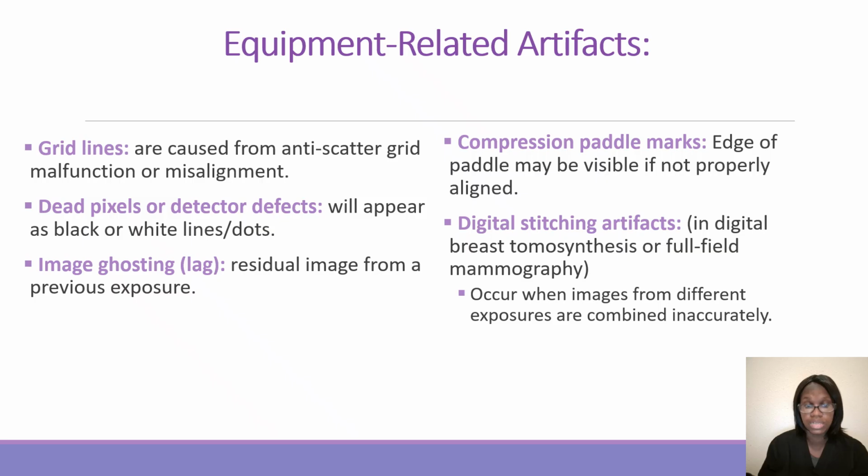Image ghosting or lag. This is a residual image from a previous exposure. I don't believe I've seen image ghosting before, but the machine that I work on, sometimes it does lag.